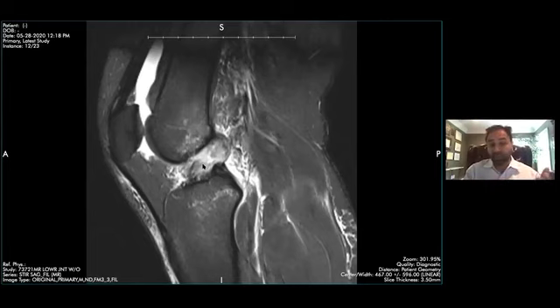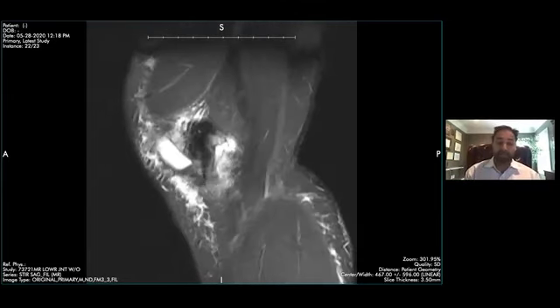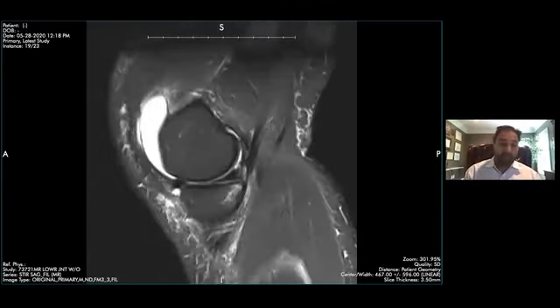This is known as the pivot shift mechanism of injury, right? If you get marrow edema along the anterior lateral femur and posterior lateral tibial plateau, the ACL is always injured. There are 4 other classic contusion patterns that I'm actually going to show one of later on in this talk. But this is the pivot shift mechanism of injury. Okay, and I want to show you another finding in this case.